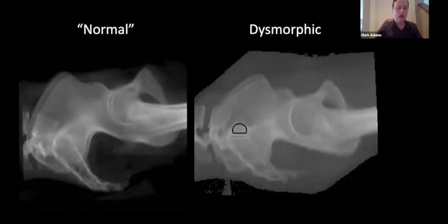For the osseous fixation pathway and neural tunnel for the first sacral segment in the dysmorphic pelvis, I have marked them here. For the osseous fixation pathway, please note that this does not represent a column of bone that runs uninterrupted from one ilium to the other, like the osseous fixation pathway in the normal pelvis I just outlined. Rather, this pathway is oblique, as we have seen on the inlet and outlet views so far.